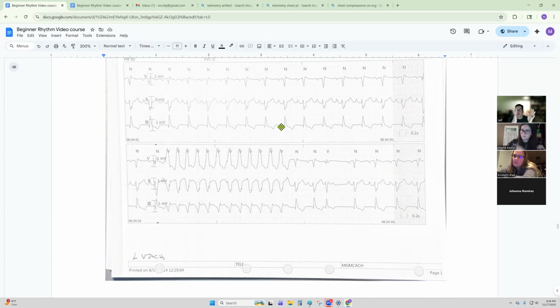So it's like a little bit wider R and then it squeezes together. There's a rhyme or reason to that irregularity. But for the most part, VTAC should be very regular because that is an excited cell of the ventricle that is just contracting in a very regular pattern. You could care less about the irregular nature of the atrial chamber.